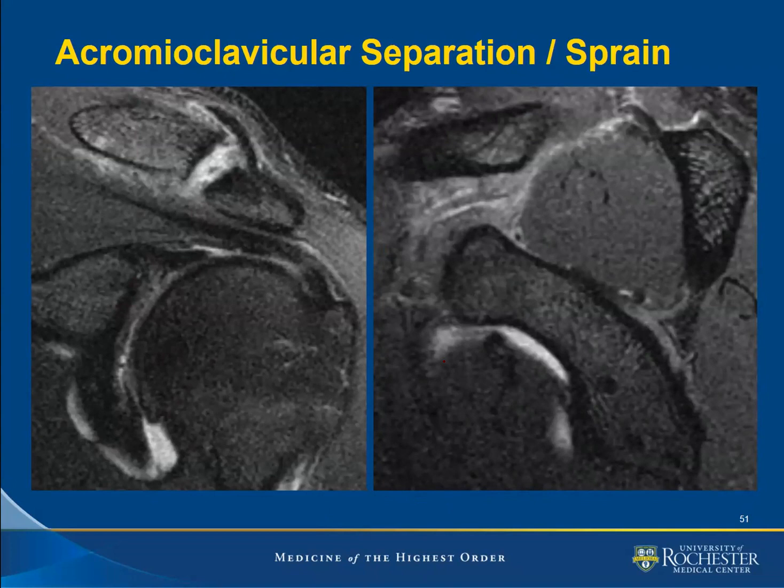Now, patients may come in with an acromioclavicular injury that's subclinical or subradiographic. They get the MRI looking for a superior labral tear, and then you discover that actually there's ligamentous injury at the acromioclavicular joint, ligamentous injury at the coracoclavicular joint, in this case in a patient with a type 3 acromioclavicular separation, which was not known to the clinician prior to the MRI shoulder arthrography.